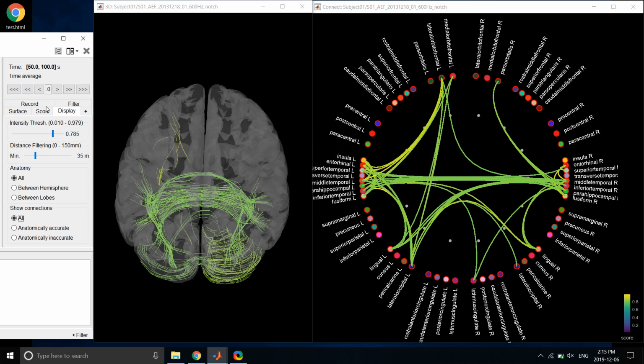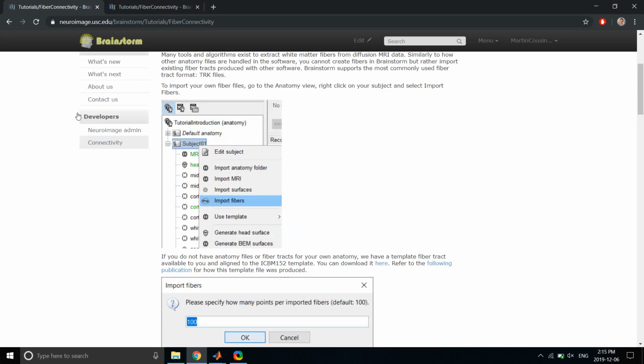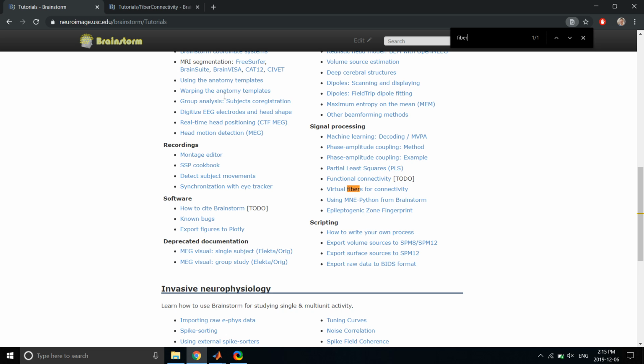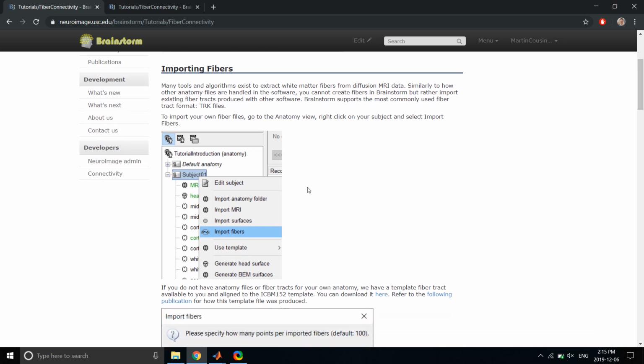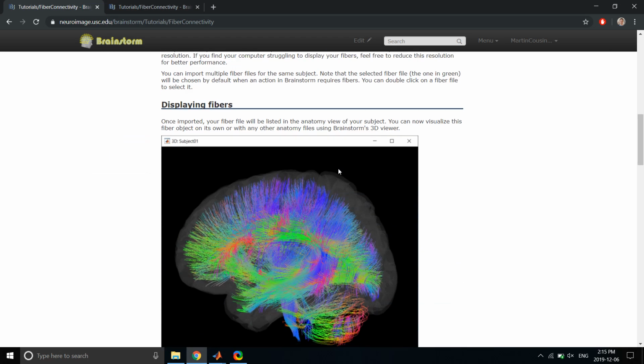Great. So this was a short introduction to our fiber display. If I close this and show you our tutorial page, let me go back to the Brainstorm tutorial page here. If you want to try it on your own or download our fiber template, just search for the virtual fibers for connectivity tutorial page. If you click on it, I have written a short introduction that shows you all the steps that I have done today to import the fibers and to plot them.